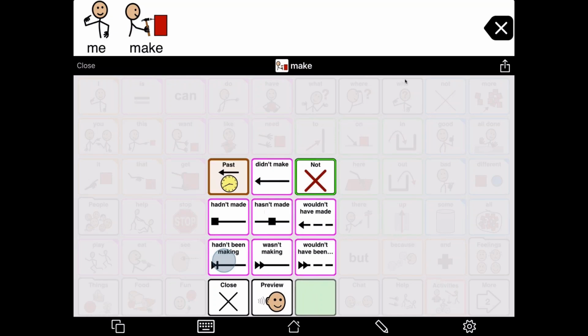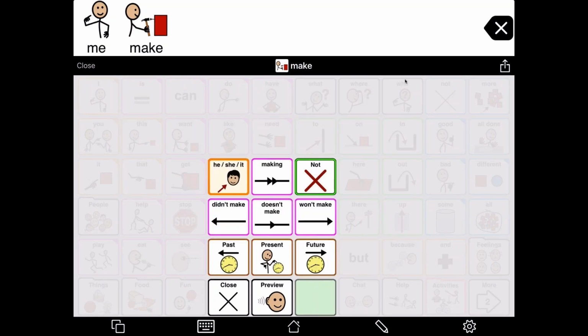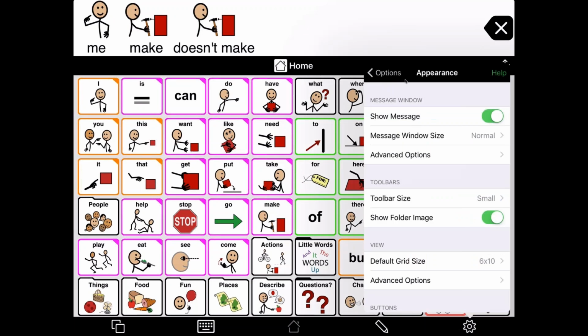I can get tons of past tense, present tense, and future tense conjugations. I can preview to try and figure out which one I want. So I can actually do a lot with the verbs automatically. As I'm sure is passing through some of your minds, that's a whole lot of stuff there, a lot of conjugations. So what you can do if you want is come in to options, go back up to the top level and find grammar.